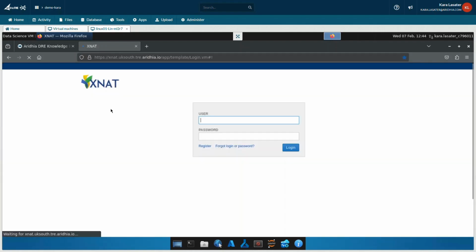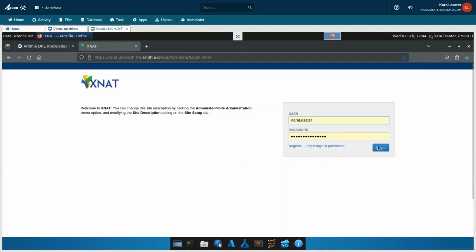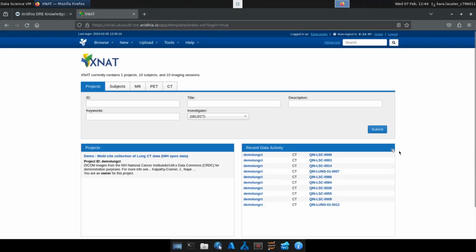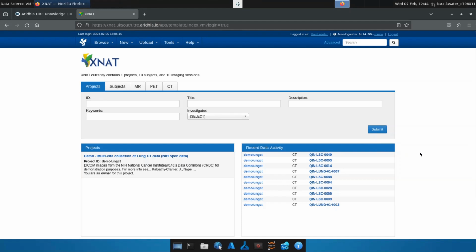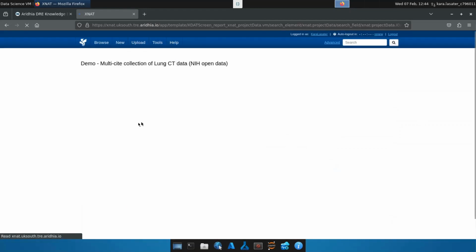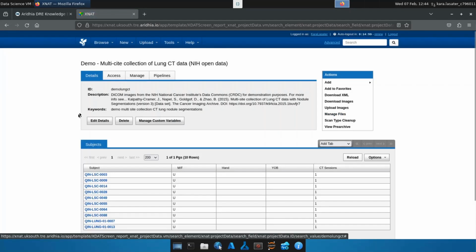Within the workspace environment, researchers can natively explore and discover a repository of medical images and associated metadata. One common way to do this is through XNAT, a medical imaging platform that approved researchers can access from their workspace virtual machines. Data owners can specify who can view, edit, or analyze the data.